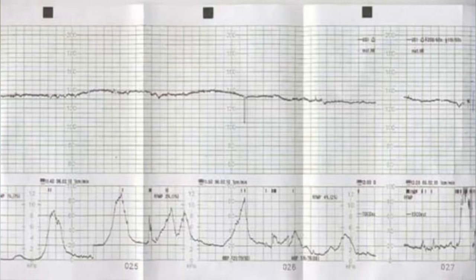The third trace, I will give you 10 seconds. Okay, we will define the risk of CTG. We have 3 to 4 contractions in 10 minutes. This is an example of reduced variability. You will see the line of the fetal heart rate is nearly a straight line, no fluctuations.